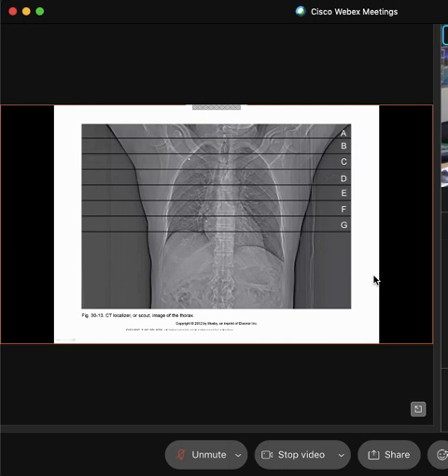As we move further down, we start to see more of the lung, right? However, we also see the tips of the clavicles. Why is this such a big deal? Because if I took G and separated it from C, would you be able to tell me which one lies more superior versus inferior? Because that's how we see our axial images. Make sense? So I'm going to pause right here and let you ask questions.